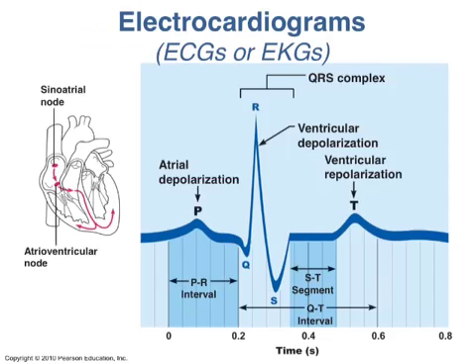A typical EKG has a recognizable pattern. You have the P wave, followed by the QRS complex, so this whole thing is the QRS complex, followed by the T wave. The spaces between these events can be informative too. You have the PR interval, which is actually measured to the beginning of the QRS segment, but it's called the PR interval. Then you have the QT interval and the ST segment.